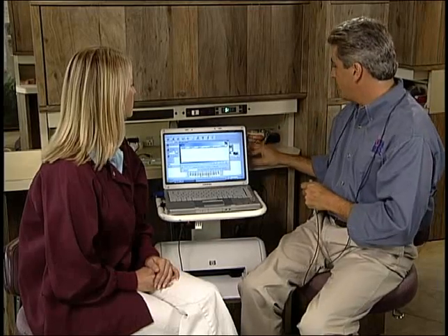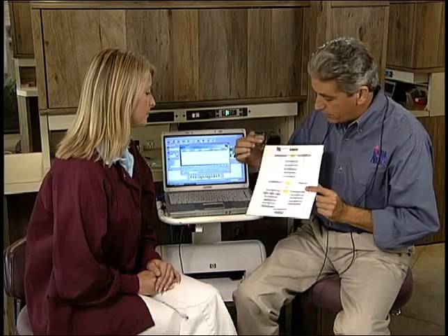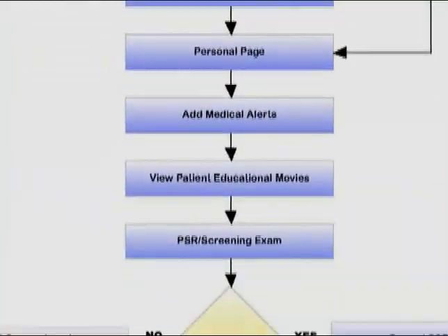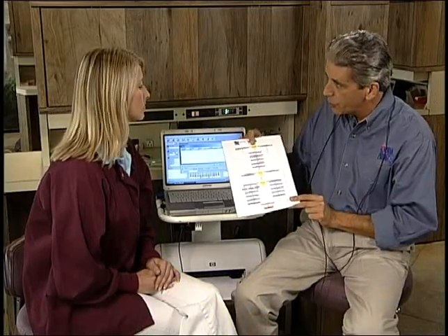Now I'm going to take a very systematic approach to this and created this flow chart. I call it Florida Probe step by step. That'll guide you through the various steps. And this, it was in your user's manual, is a good reference tool. Okay.